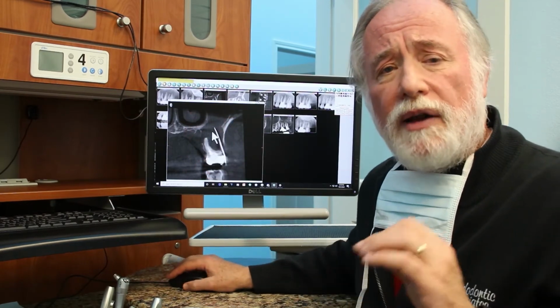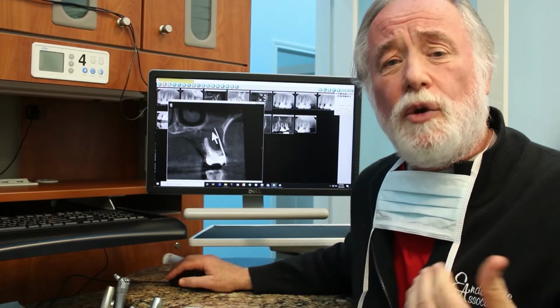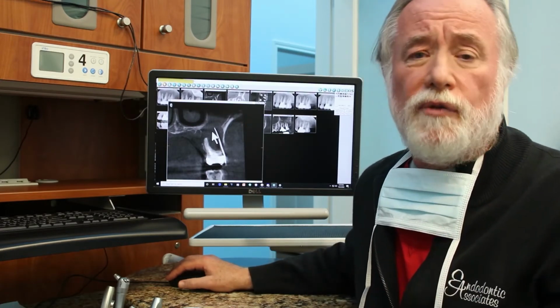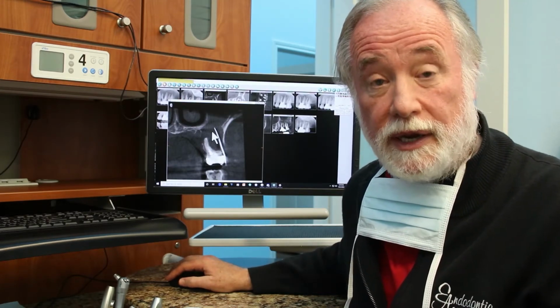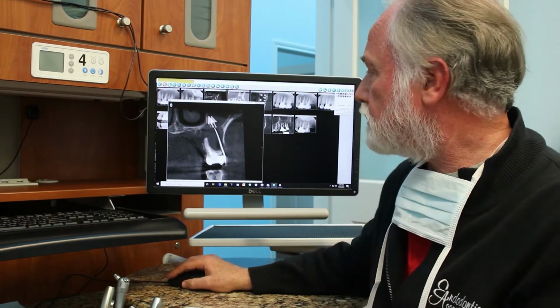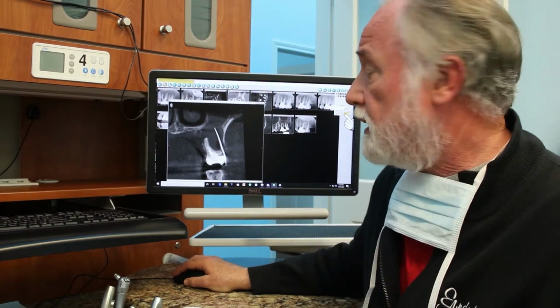We know that about half of chronic sinus problems are really tooth problems. They're not sinus problems at all. So by checking these things out and making sure your teeth are okay, you may avoid a little sinus surgery. Now, that's not to say that we're going to take care of your root canals and you'll never have sinus problems again. But obviously something like this is going to cause a problem in the sinus. So let's take a look at that also then. We'll look at some of the other portions of that CBCT x-ray.